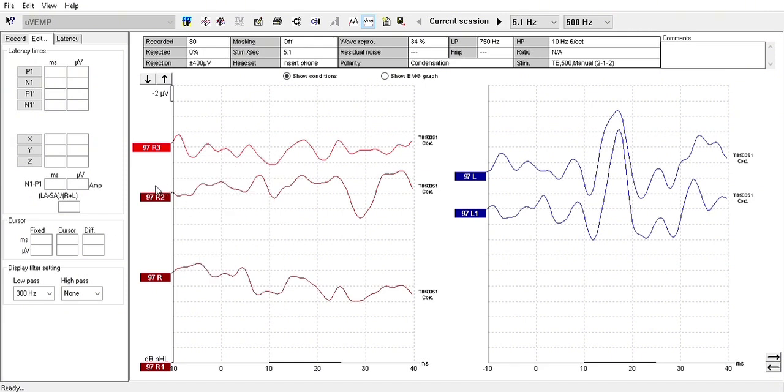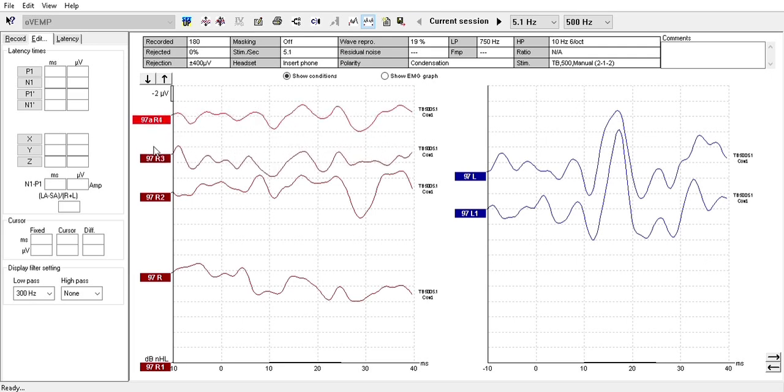The other thing that I tend to prefer is to double click on one, right click on the other, and then we're going to add this curve, and it creates a third curve. Now, how do I know which one that is? If you look in the handle, there's a little A. That is my added curve. So I've got added curve listed right there.